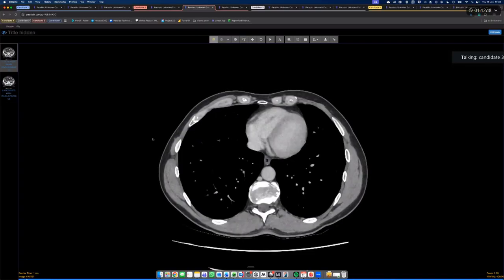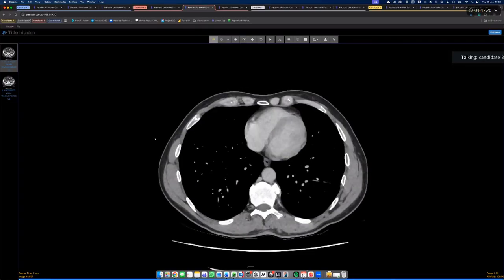So I just wanted to ask, in the last scan, there was no interstitial fibrosis in the lower lobes? It was all severe emphysema. Okay. I think honeycombing can be overcalled, particularly when you've got quite extensive emphysematous change. One of the things that would push you towards interstitial fibrosis over just widespread emphysema is, number 1, volume loss, and number 2, tractional dilatation of the airways.